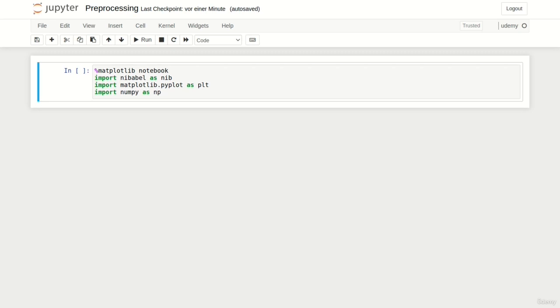Hello everybody and welcome to the last lecture of our lecture series Datasets and Preprocessing. In this notebook you will learn how to handle three-dimensional medical image data and how to preprocess those datasets. To demonstrate this, we will use a brain MRI scan distributed by the IXI dataset. We already provide this file in the corresponding directory.